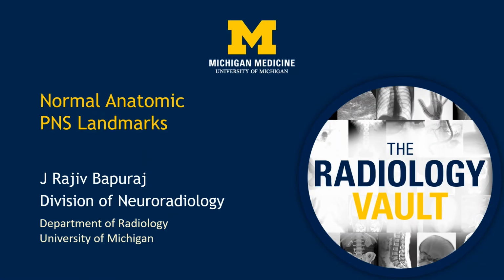This presentation summarizes the normal anatomic imaging landmarks of the paranasal sinuses relevant to functional endoscopic sinus surgery.